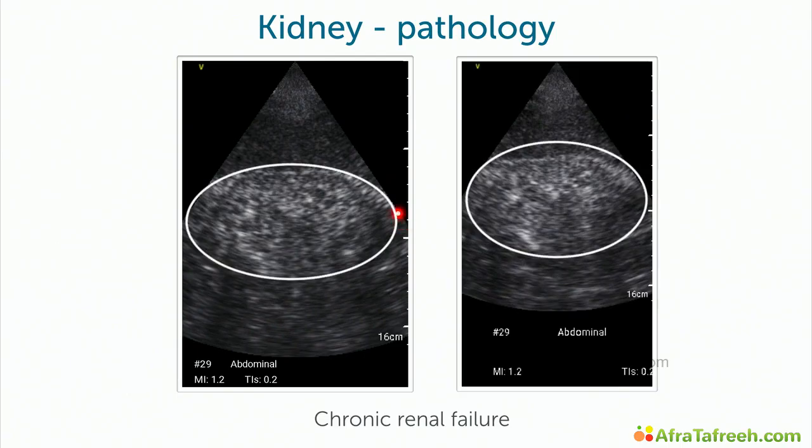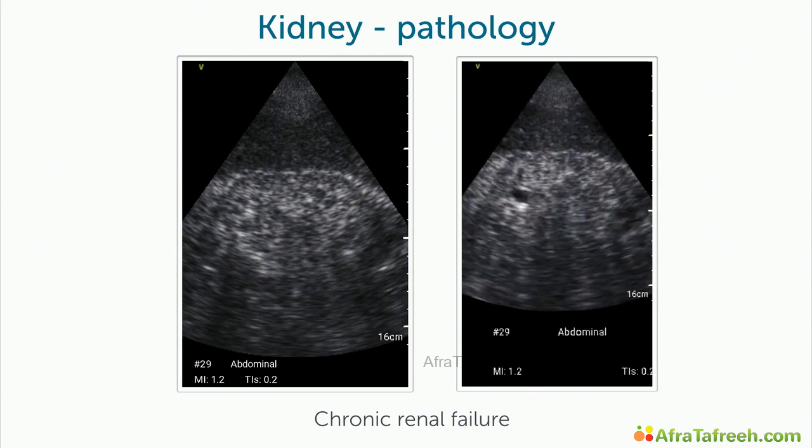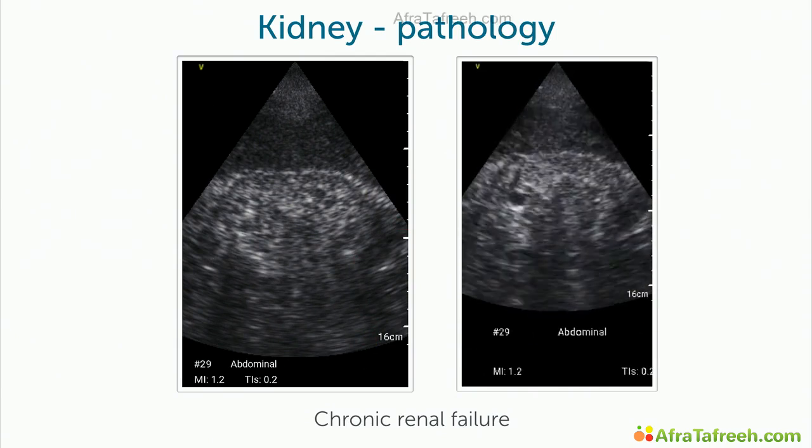But in addition, I would like to show you some other very important clinical images or situations which you have to be aware of. That is the typical image of a chronic renal failure. That would always lead to a laboratory finding which shows you the degree of the renal malfunction. This, of course, doesn't cause any pain to the patient, but can affect the patient when contrast medium is applied.